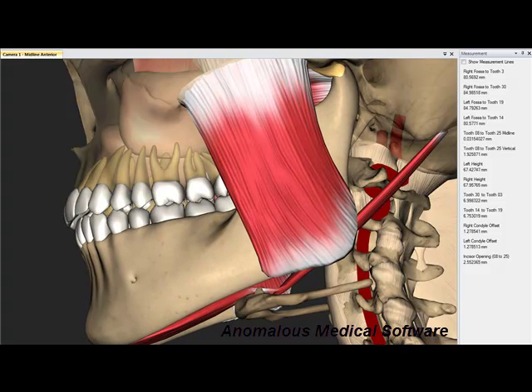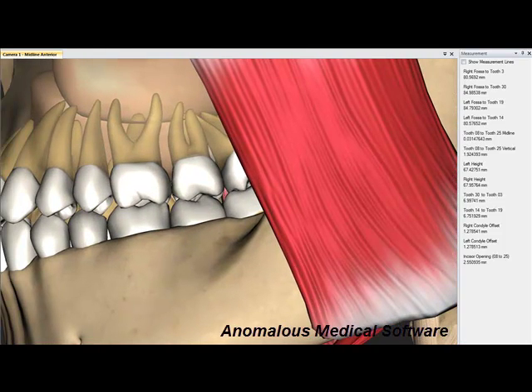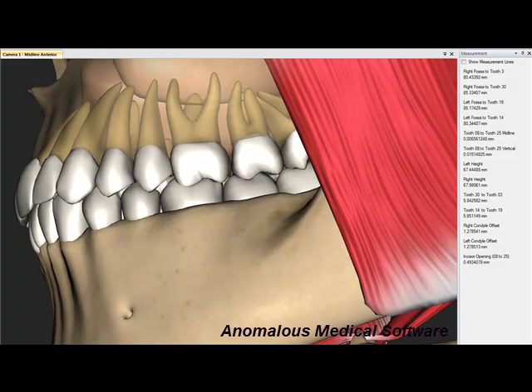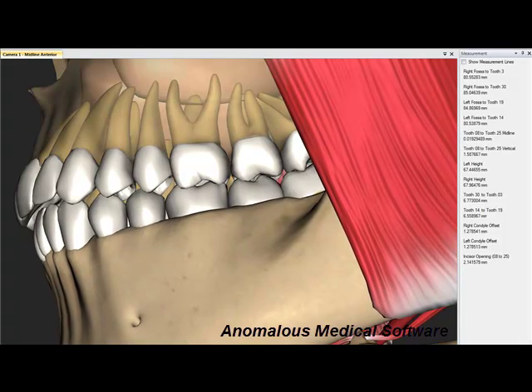Now at that particular magnification, that may not be readily seen or readily understood, so I'm going to go ahead and take the model and blow it up to where we can actually look at the teeth a little bit better, and I'm going to go ahead and hit my adaptation, and you can appreciate the fact that teeth are moving and intruding, especially on the maxillary arch. And I'll take this back one more time to the non-adapted state.